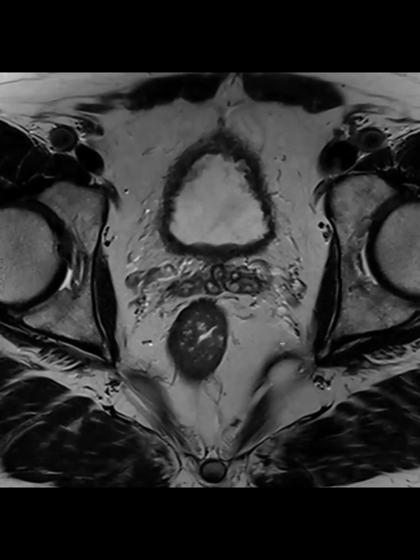I have a question. So they did this prostate MR because presumably their PSA was elevated. Yeah, and biopsy was negative. Can granulomatous prostatitis elevate your PSA? Just out of curiosity. I think so. I mean, I have to look it up just to confirm, but I think so. Just a fake out. That was the first time I've prospectively called granulomatous prostatitis.